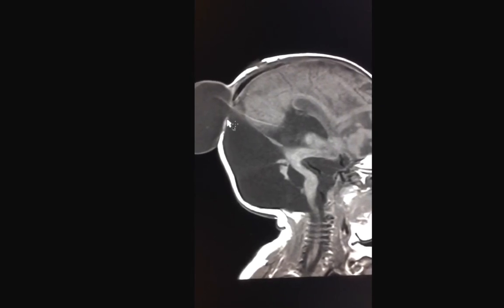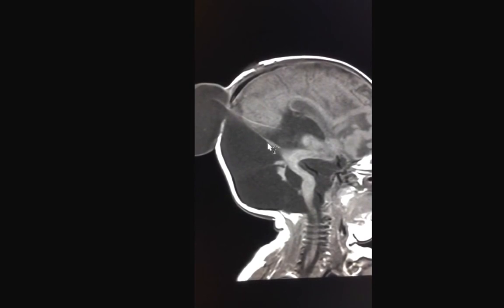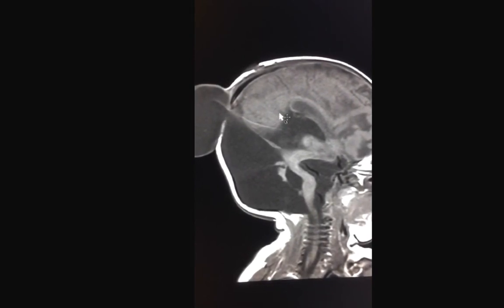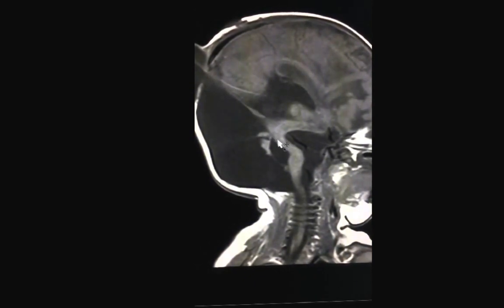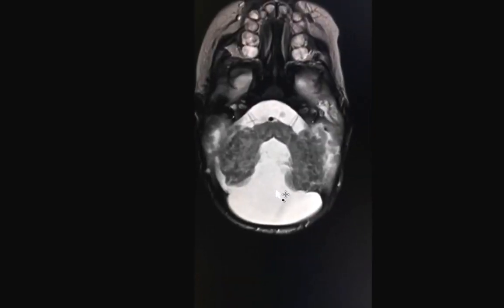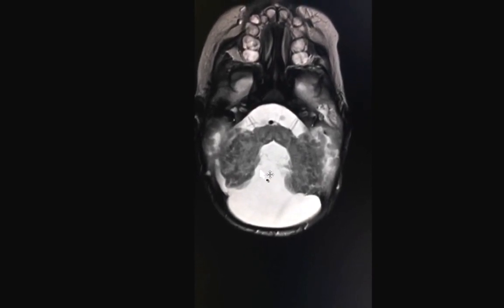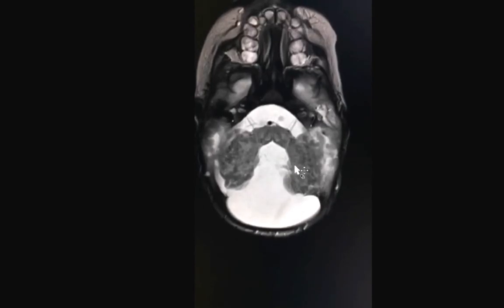This structure leads to elevation of the confluence of the venous sinuses and elevation of the posterior aspect of the brain. The brainstem itself is distorted and hypoplastic. The posterior fossa cystic abnormality communicates with the fourth ventricle, and the central aspect of the cerebellum is hypoplastic.